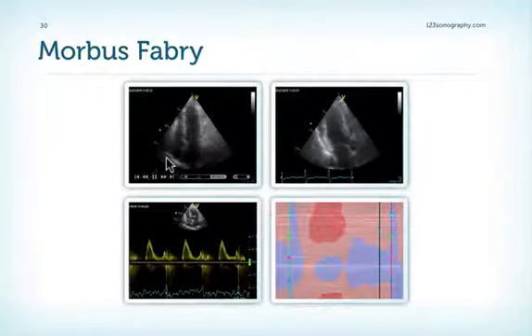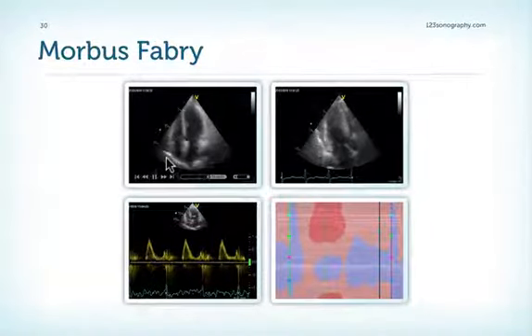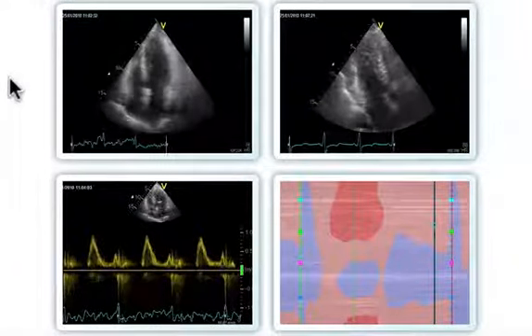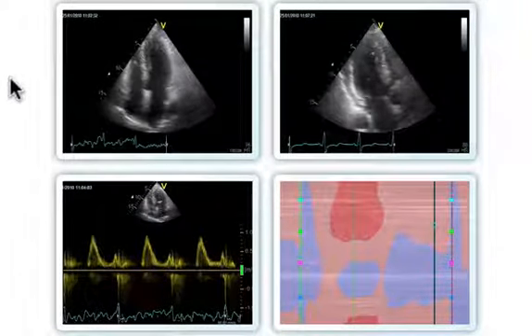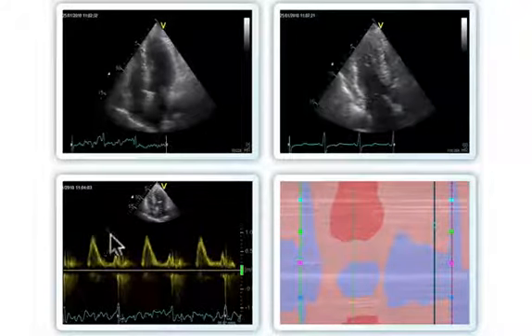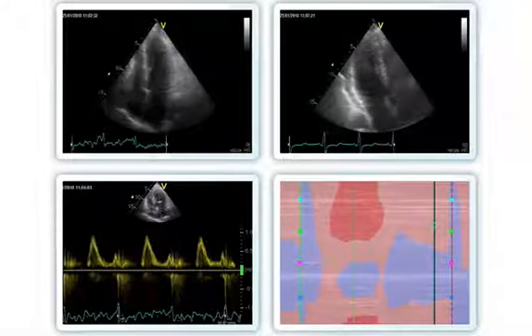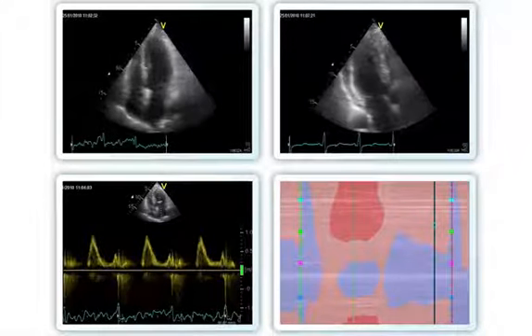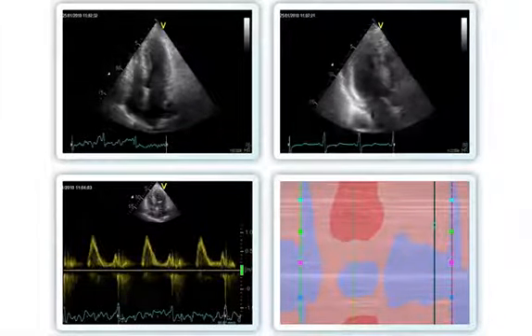The echocardiographic findings in morbus Fabry are quite unspectacular. The key feature is left ventricular hypertrophy. Again, in the absence of hypertension. Note that we also find a restrictive filling pattern, especially in advanced forms. Remember, we're talking about restrictive cardiomyopathy. And what we sometimes see is abnormal strain and strain rate patterns.